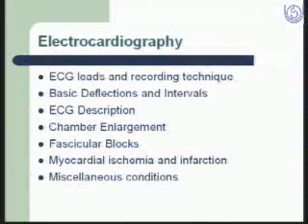Now in the next 20-25 minutes we will be seeing various concepts about ECG: the ECG leads and the recording technique, basic deflections and intervals, the description of an ECG, and then after the normal ECG we will see certain abnormalities like chamber enlargement, fascicular blocks, myocardial ischemia and infarction, and a few miscellaneous conditions which are encountered in common practice.